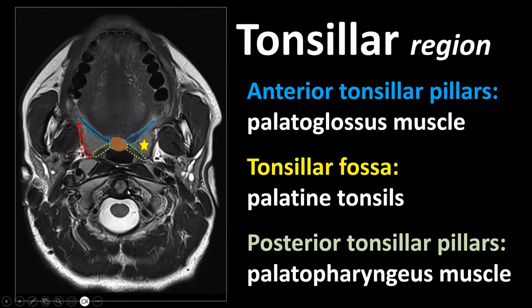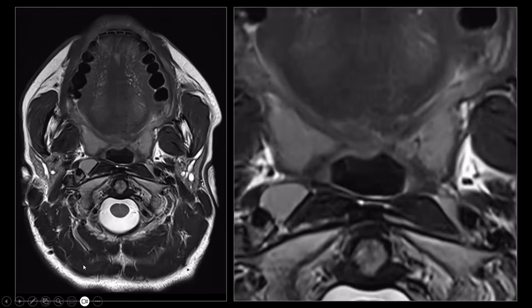Then we have this muscle over here lining the lateral part of the palatine tonsil. What muscle is that? This is the superior, depending on the level you're looking at, could also be the middle, but probably the superior constrictor muscle over here. And the superior constrictor muscle not only forms the lateral wall of the tonsillar fossa, but also runs in the posterior pharyngeal wall. So this is the superior and/or middle constrictor muscle. I magnified this a bit to make it even more clear.